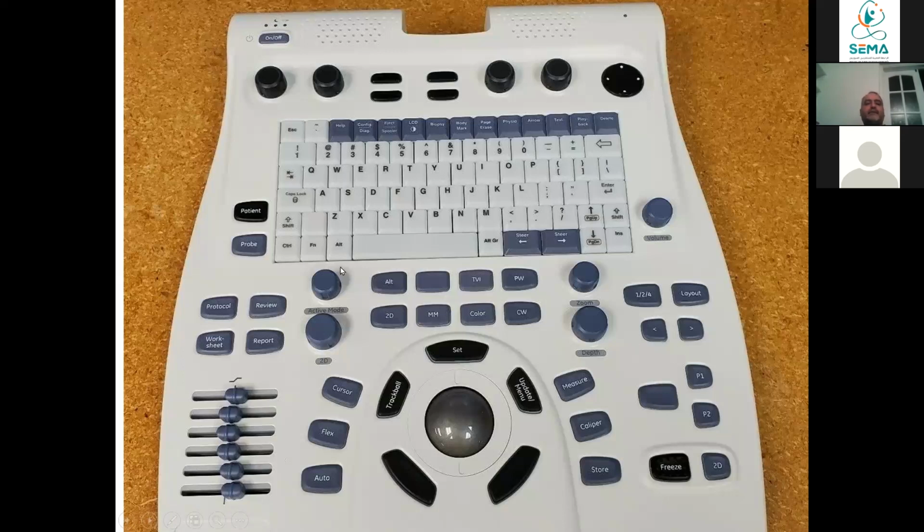For more details, I think those people who are interested in echocardiography will attend the training, so they will know more about CW, continuous wave Doppler, where you want to know the velocity across the whole area, and the pulse Doppler in a certain area.